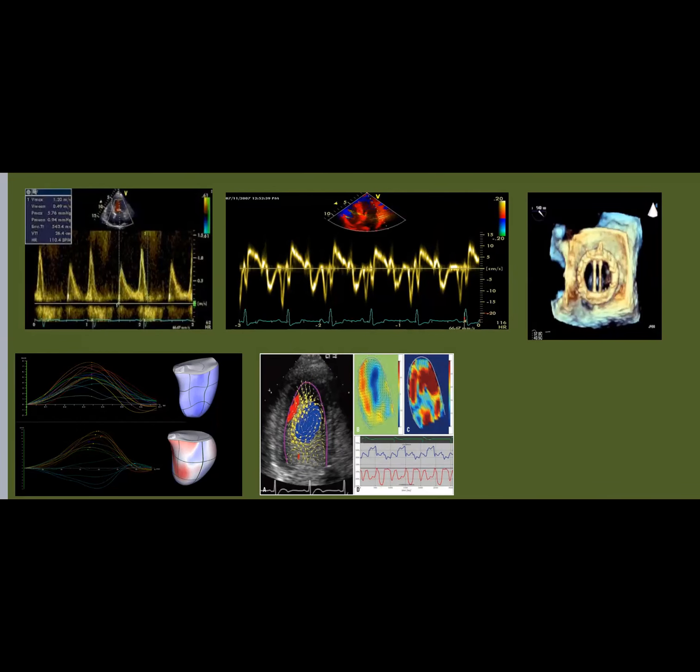What kind of flow dynamics we can map out in the LV with severe versus mild versus moderate. Okay, so that will take us to a different zone of conceptualizing echo diseases, and probably we're going to change our mind about severity and stuff like that.